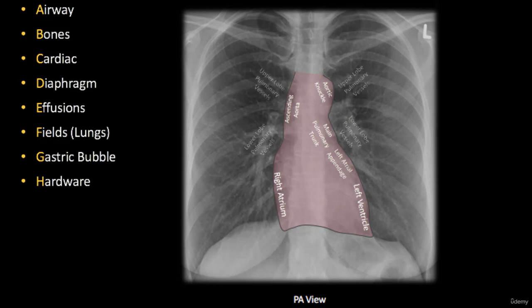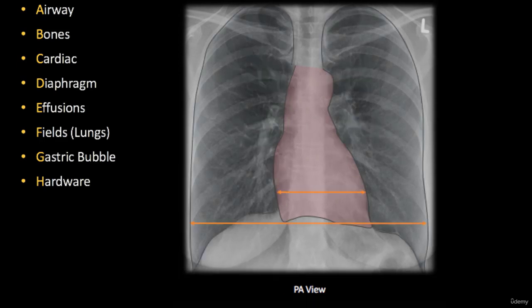This part of the heart may be damaged in case of trauma, and the left border of the heart is made by the left atrium above and by the left ventricle below. The diaphragmatic surface of the heart lies almost completely on the diaphragm. From here comes the name.